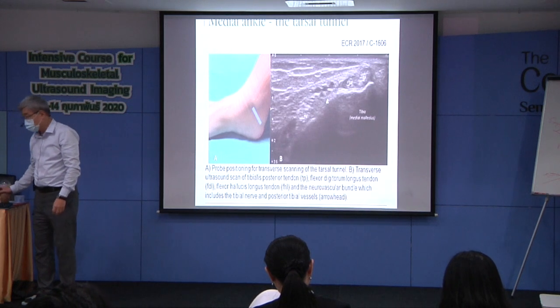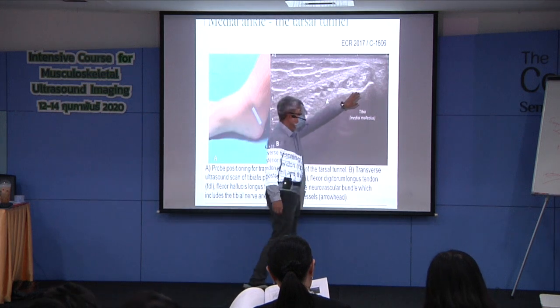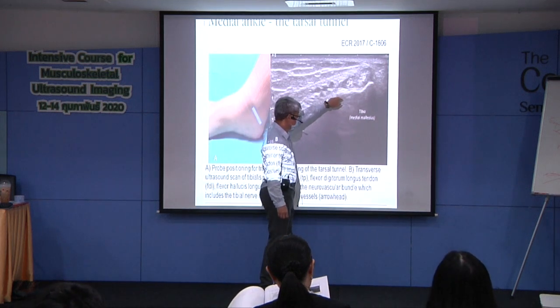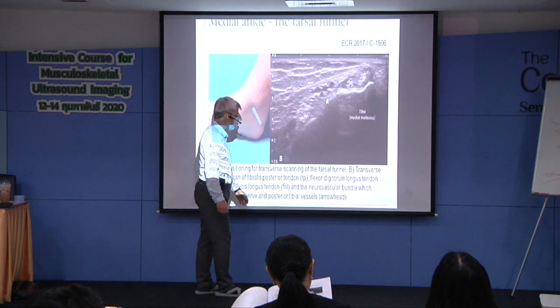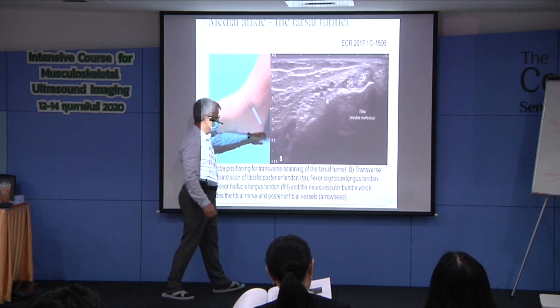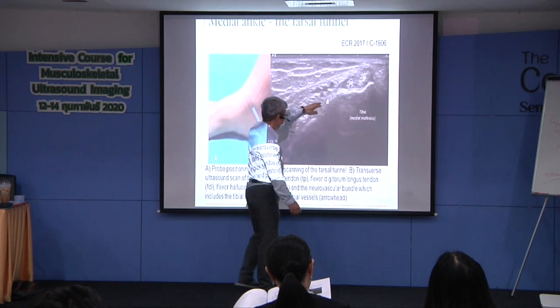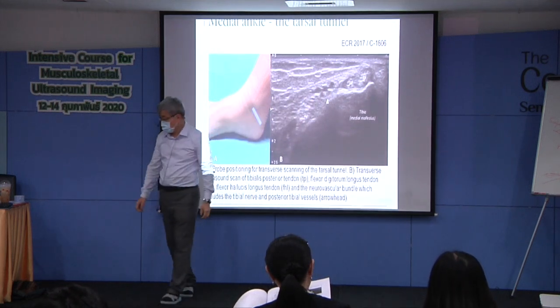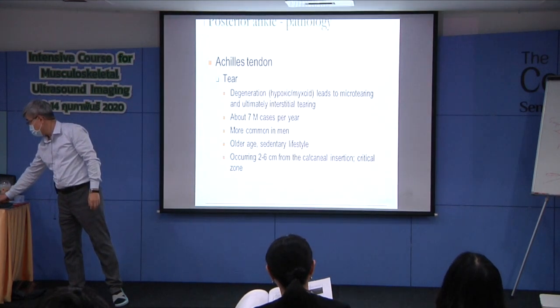Okay? Tarsal tunnel, you don't have any problem with this, right? Tibialis posterior, flexor digitorum longus tendons, flexor hallucis longus tendons, nerve, vessel, no problem at all.